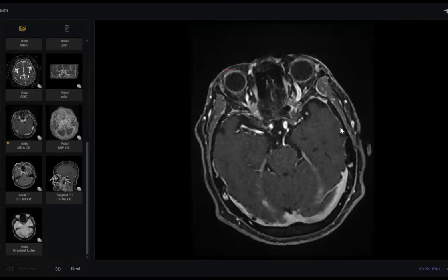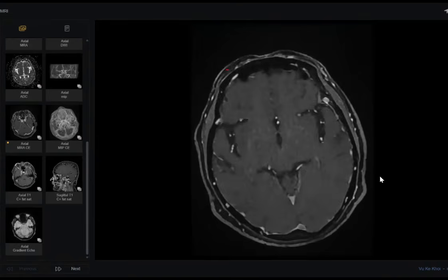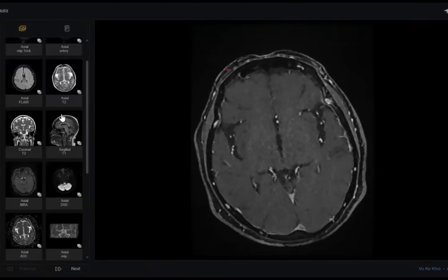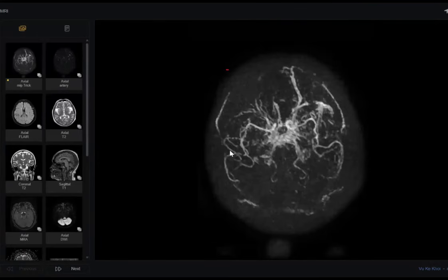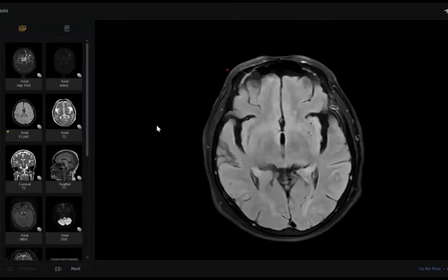Okay. So take care of this case again, because the examiner will not give you much help, especially from FLAIR studies. On FLAIR, you can pick it up.